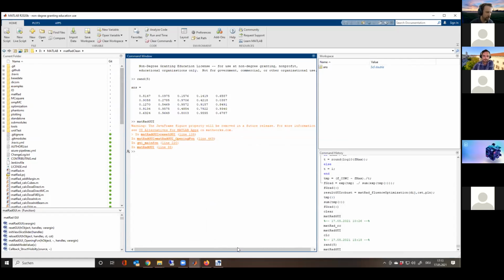Okay, so this is the most important function, and you see that this function also starts, for the MATLAB users among you, by adding everything to the path and so on. So every function is now known to the MATLAB environment. The important point is that you always start off from this path and start with this function. You see there's a warning here that I need to get rid of at some point, but for now it's not that important.